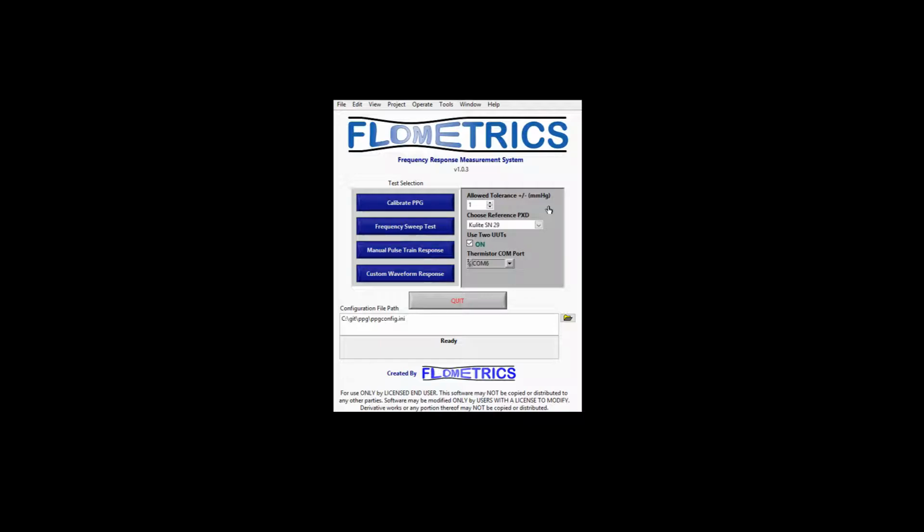To calibrate the PPG, with the FRMS software started, make sure the global configuration items are set appropriately. Then, click on Calibrate PPG. The calibration window will appear. Ensure that the static pressure in the PPG is within the green range of the static pressure meter. If so, press Calibrate PPG to run the calibration sequence. If the static pressure is not within the green range, equalize the pressure in the PPG chamber with ambient. See the PPG filling videos for more information.